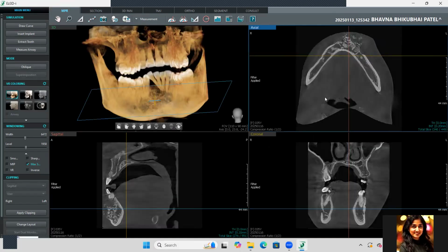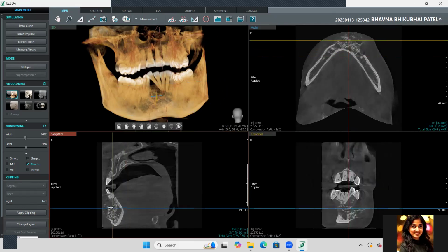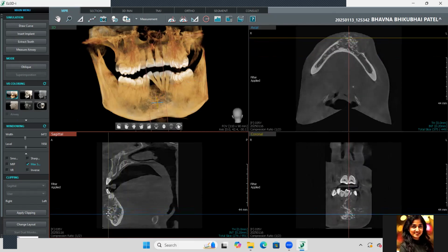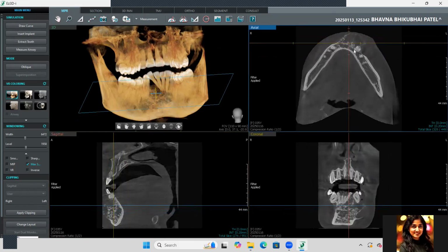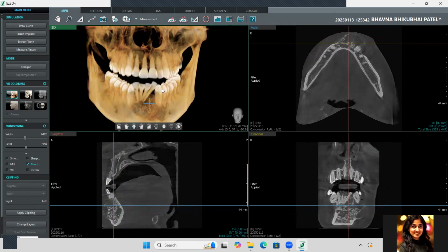You can see this, such a big expansion. Usually, there are some lesions and cysts which expand more buccolingually rather than mediolaterally. These are also some points to diagnose and differentiate the cases. So that's about it. We can measure the length, the highest diameter width as we have measured in the radicular cyst. The patient is not positioned straight in this. Wait, just okay.